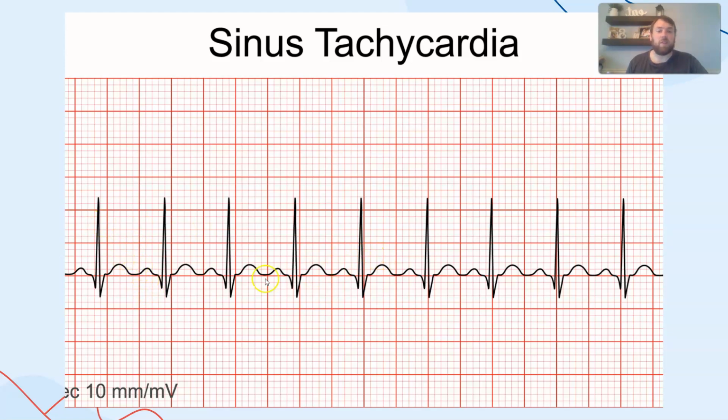That would experience a very fast heartbeat over and over and over again. It doesn't matter how evenly spaced they are, this individual is experiencing a heartbeat that is too fast, too frequent. We call that tachycardia.